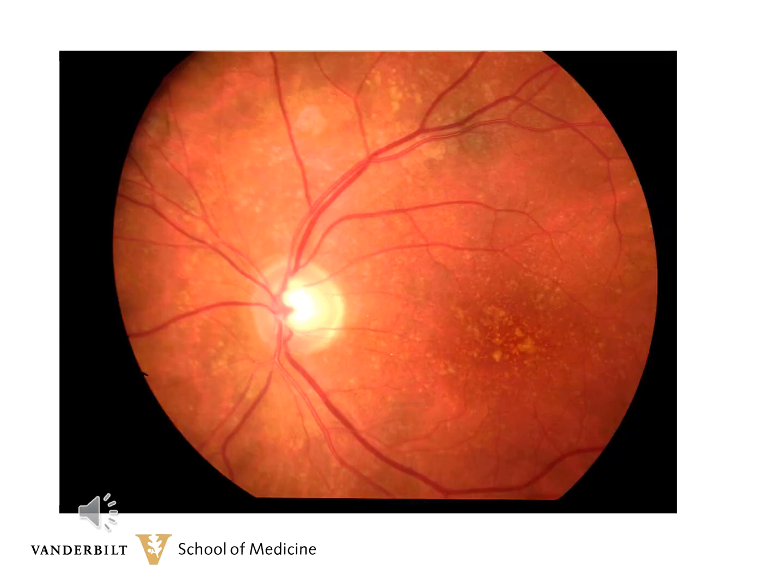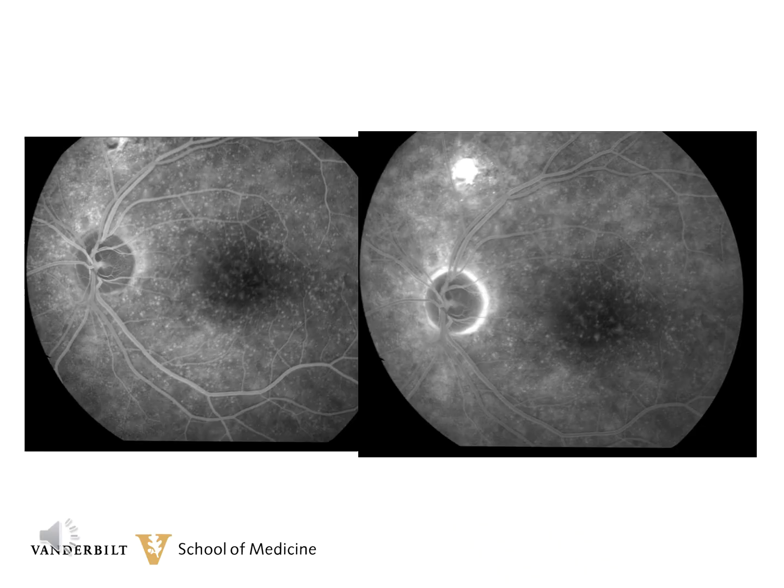This is a 73-year-old female who has a choroidal neovascular membrane in her fellow eye. The left eye has some obvious drusen near the fovea. Note on the angiogram here that you can see not only the drusen you could see clinically around the fovea, but there are others in the nasal macula that you cannot see on the clinical slide. Also, in the far superior area of the photograph, there's leakage from a peripheral choroidal neovascular membrane.